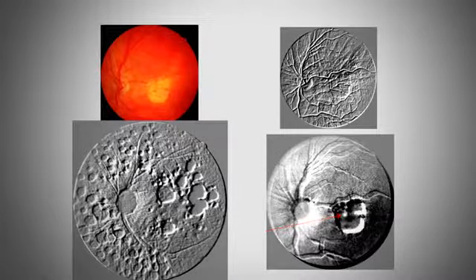So this is the importance of having a way of measuring how much damage the patient has now, which is black or gray, and how much damage the patient will have in the future. That would be the white banding. And that's why it's so critical to look at a value that is truly medically representative of what's happening in the back of her eye: the grayscale unprocessed.